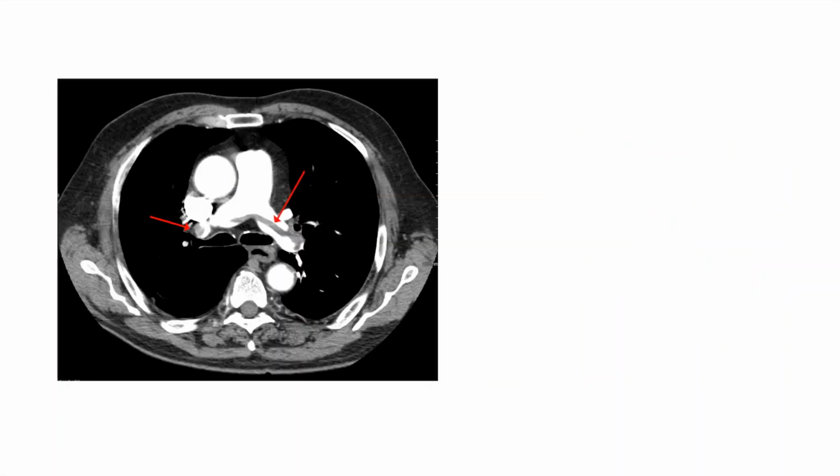What does this CT angiogram show? It shows multiple filling defects. So this is a large pulmonary embolism at bifurcation of pulmonary artery.